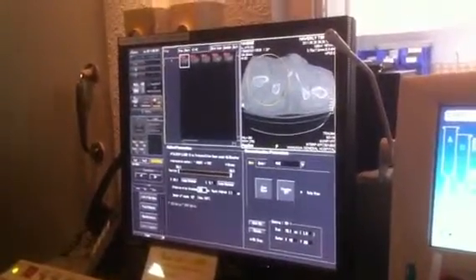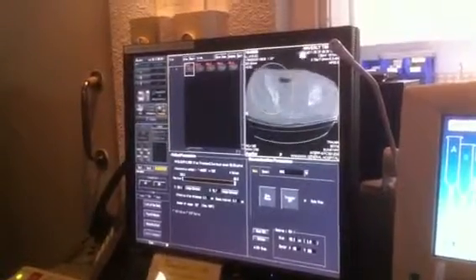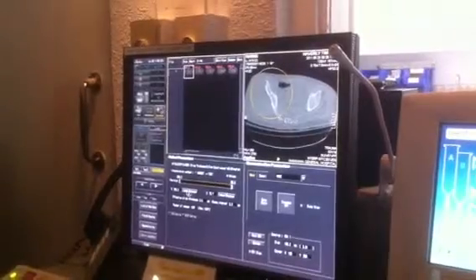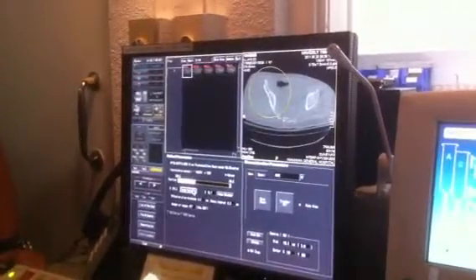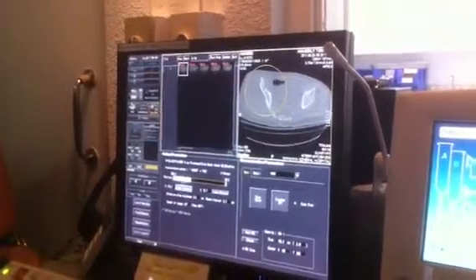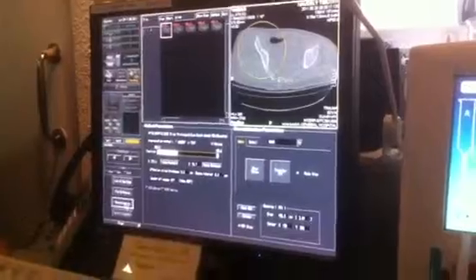And I'm going to do a start and end, because the hip's not on all of these images. So maybe I'll start here. So I'm going to hit image selector. And that takes this location and puts it right inside here. See that? Now I don't have so many images. I'm going to reconstruct.